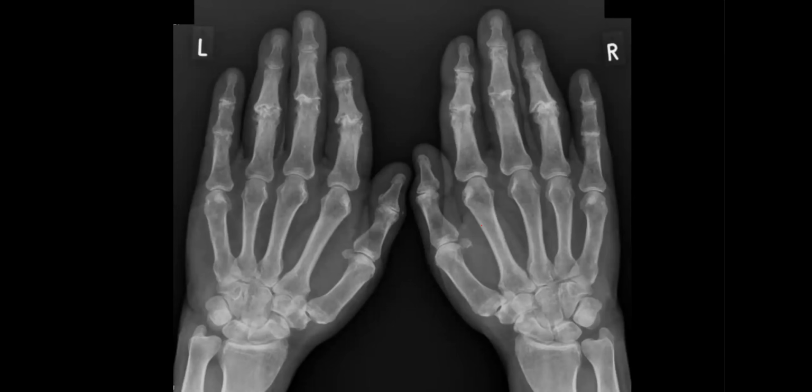What about this case? Sir, this is an X-ray frontal projection of the hand. I can see there is loss of joint space with marginal erosions, as well as new bone formation and periosteal reaction along the proximal interphalangeal joints of both hands, with associated soft tissue swelling. Sir, again, this is the seagull sign. Yes, correct this time. This is a classic seagull.